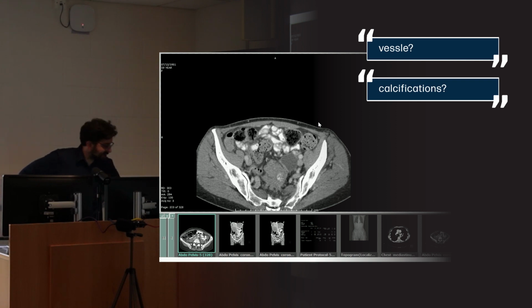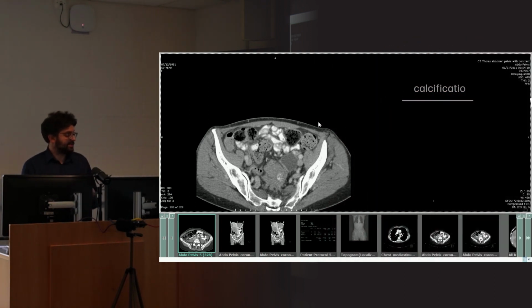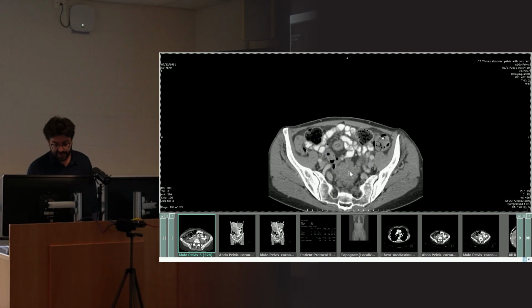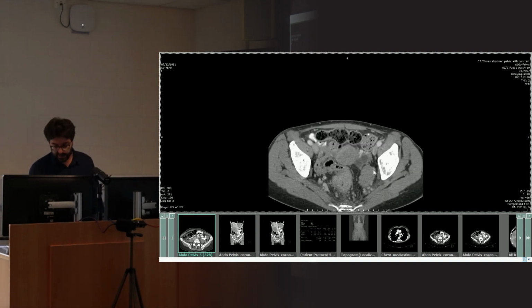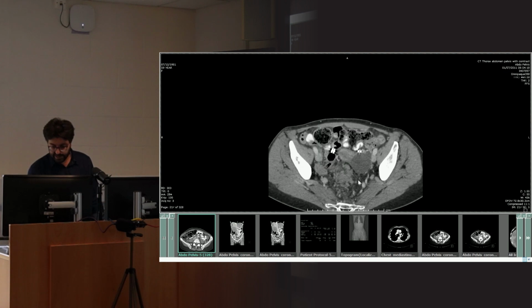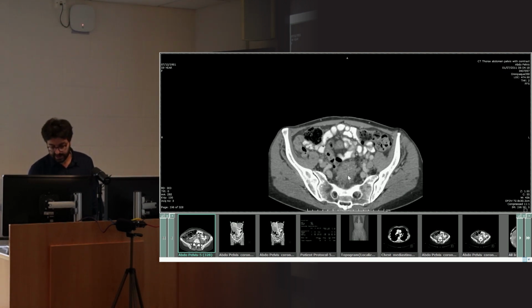Yes, absolutely right. So that's calcification. So you can see how you can use the Hounsfield values to tell you so much about what you're looking at. There's basically little foci of calcification within that nodal disease. So we have a rectal tumor, we've got nodal disease. This node here contains some cystic necrotic bits. This node here contains some calcification bits and maybe some necrotic bits.